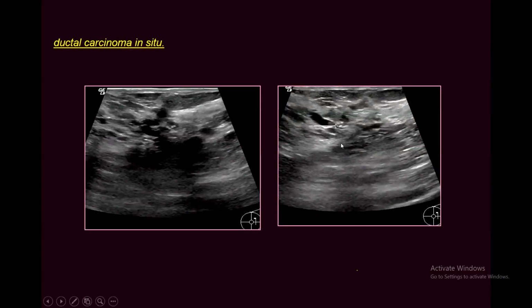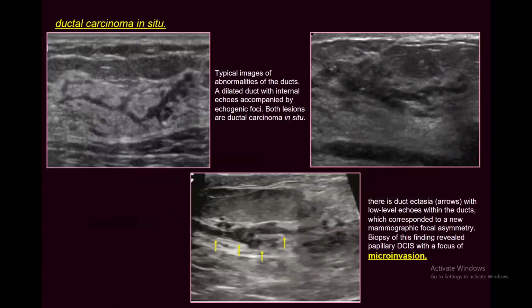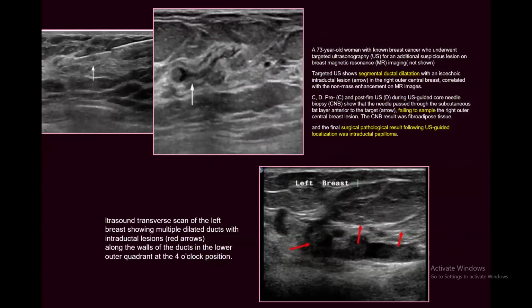or in situ. This is my patient having segmental ductectasia with calcification in a case of high-grade DCIS. These are examples of segmental ductectasia within the parenchyma. You can see these irregular hypoechoic ducts with beaded appearance and soft tissue component, and this associated with calcification, again, soft tissue. All of these represent DCIS, and this example associated with micro invasions.